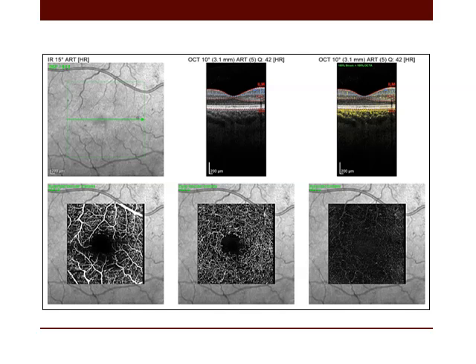Of course, if the motion is absent or slow, it will not detect it, and this is one of the disadvantages of the currently available OCT angiography. However, many advantages were obtained so far, which are the presence of two vascular complexes highlighted with the OCT angiography, not only the superficial ones that can be seen with fluorescein angiography alone.